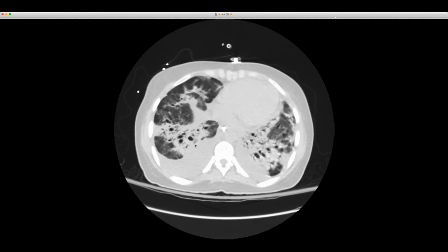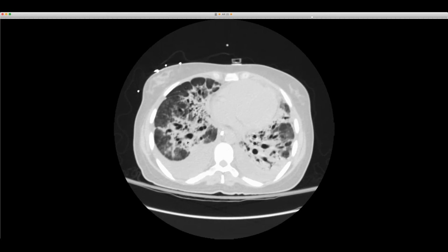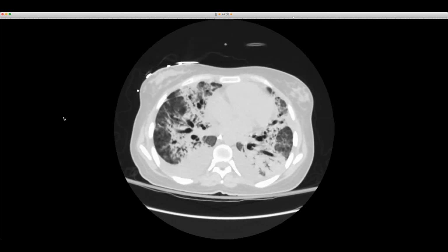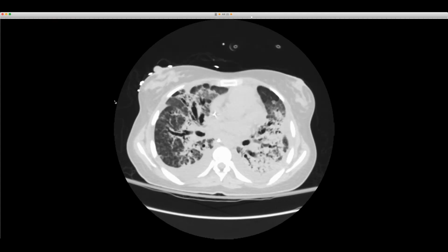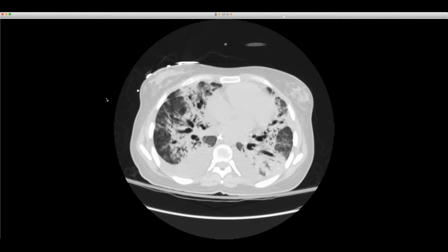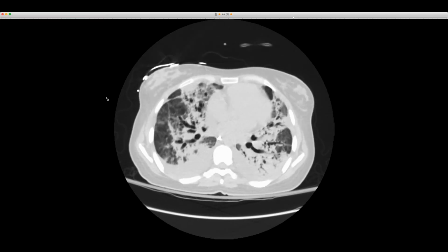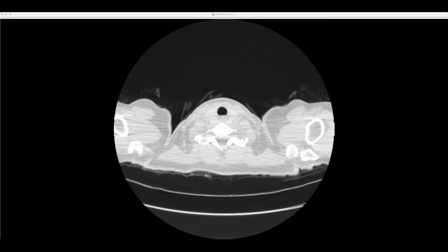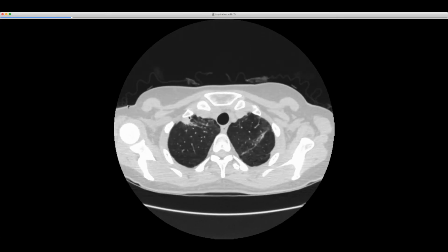And you can see here this really nice bronchial dilatation pattern within the lower lobes with dependent consolidation, ground glass and everything. You can see some bronchial dilatation anteriorly too. And of course, this suggests an ARDS pattern and diffuse alveolar damage in the setting of her influenza pneumonia. Flipping back to the other CT, this is the classic anterior predominant fibrosis that you can get after ARDS.